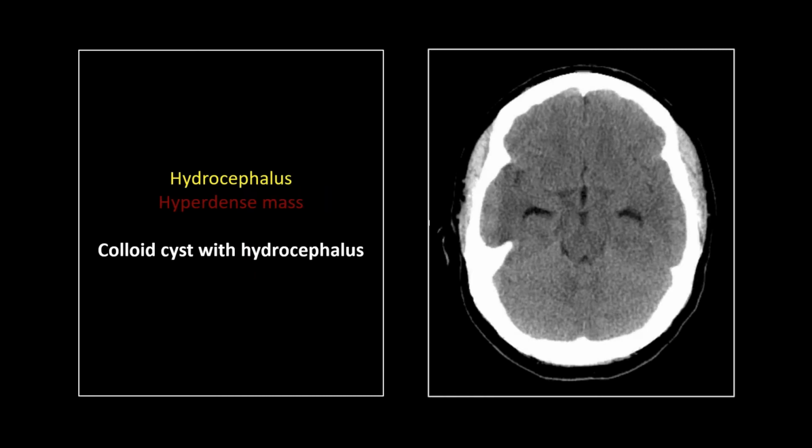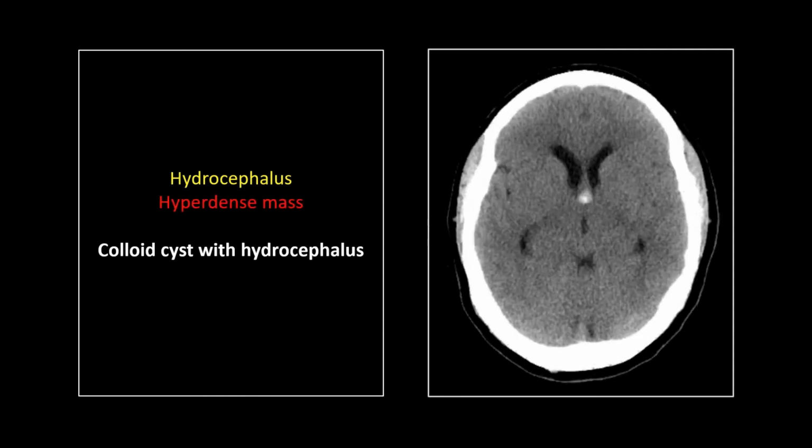This is a neat one. Again, those inferior horns can be so helpful. They're a great gauge for early hydrocephalus, especially in the younger folks. When you see them this prominently, you know there's hydrocephalus, and sometimes they can look like this without the lateral ventricles necessarily being enlarged. There is apparently less resistance in the white matter of the temporal lobes to expansion of the ventricles. So in this case, though, there's hydrocephalus elsewhere as well.